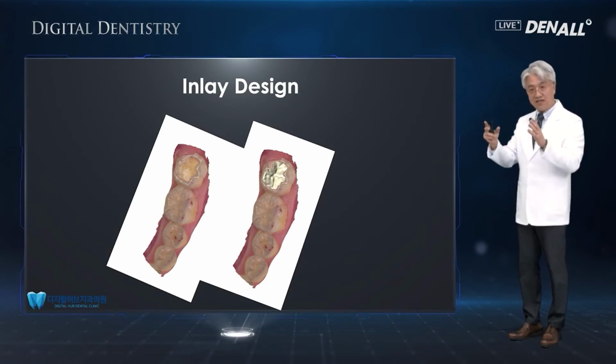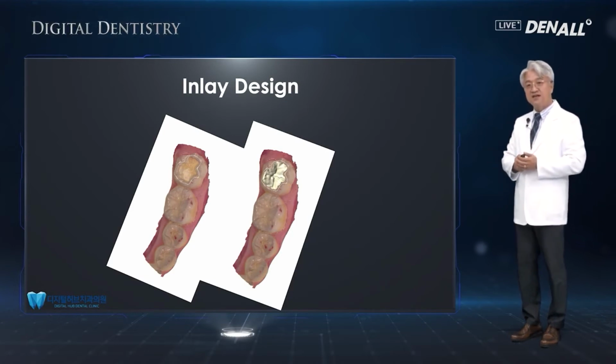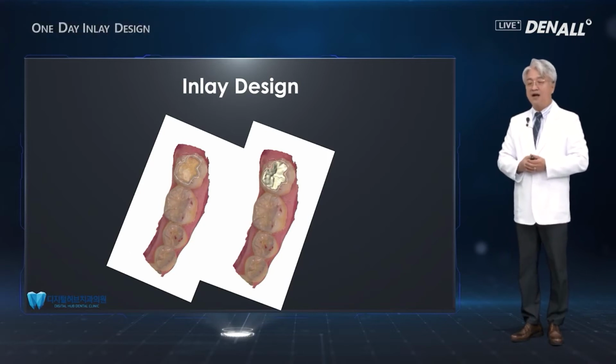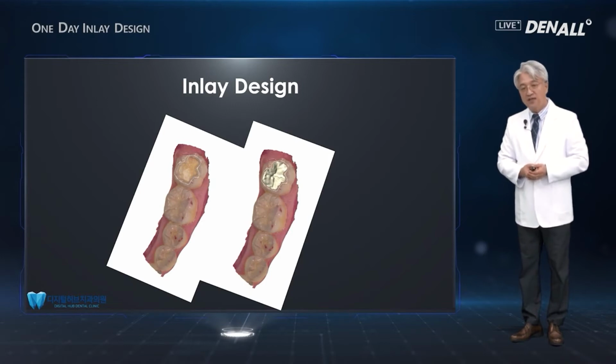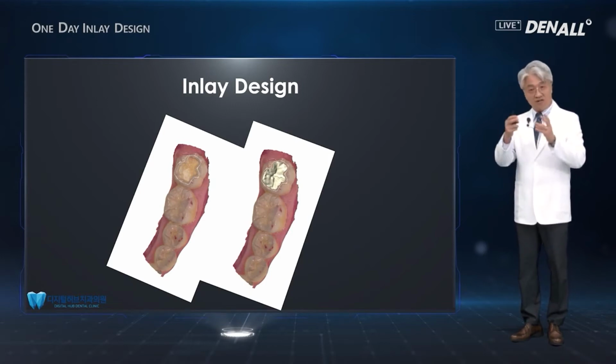And this 3D data is printed using the 3D printable files, and that inlay is made. Only 1 or 2 years ago, or if it's inlay, actually only a few months ago, blocks had to be milled.